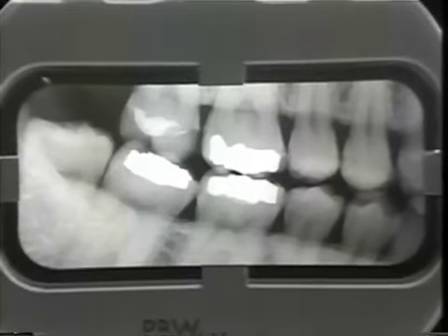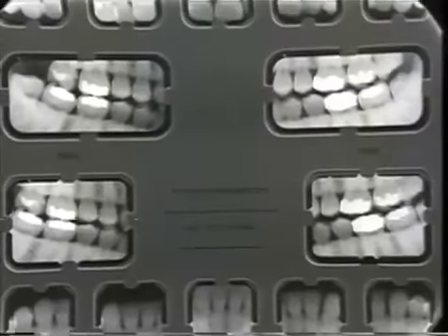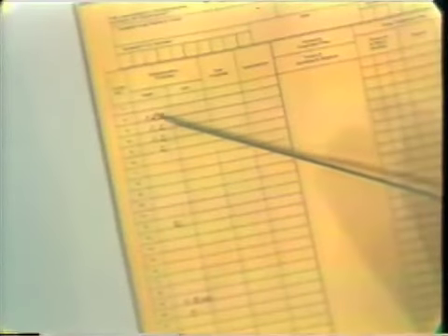Now we can enter these on the posterior bite wing findings, or rather, we can confirm them and see that the patient has done a correct recording job. It can be seen that the patient has filled out the form under posterior bite wings correctly.